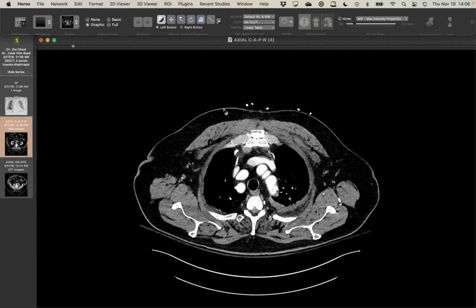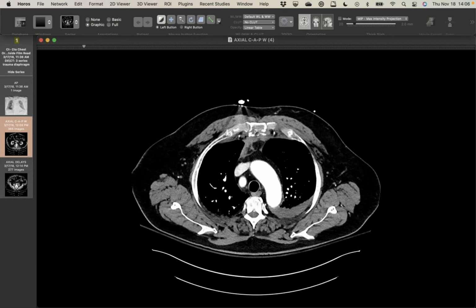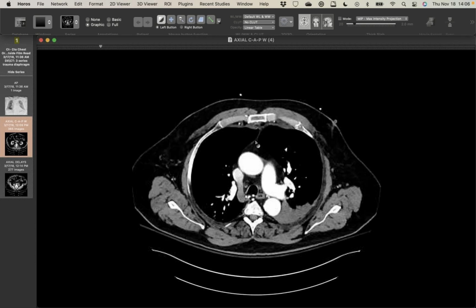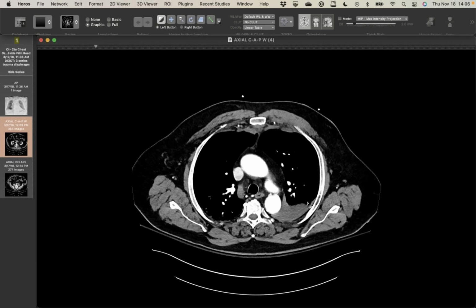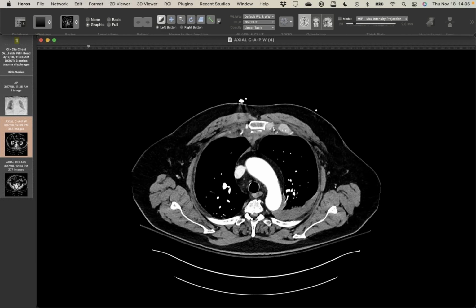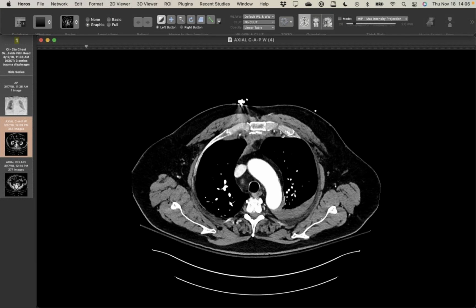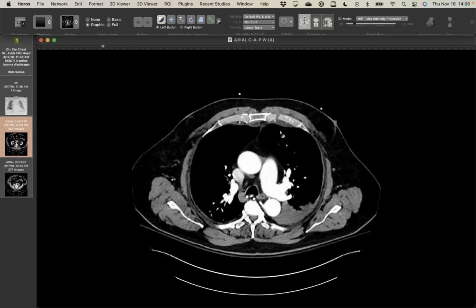And the area of interest, there's a hemothorax here. You can see there's a retrosternal hematoma. So there's some fractures. There's a sternal fracture. There's a couple of things I want to show. Well, first is the hemothorax. So initially looking for the rib fractures, if you look just at the bones, you won't see any. But if you look anteriorly here, you'll notice there's a disruption of the rib cartilages. And this can actually cause quite a bit of destabilization of the chest wall.